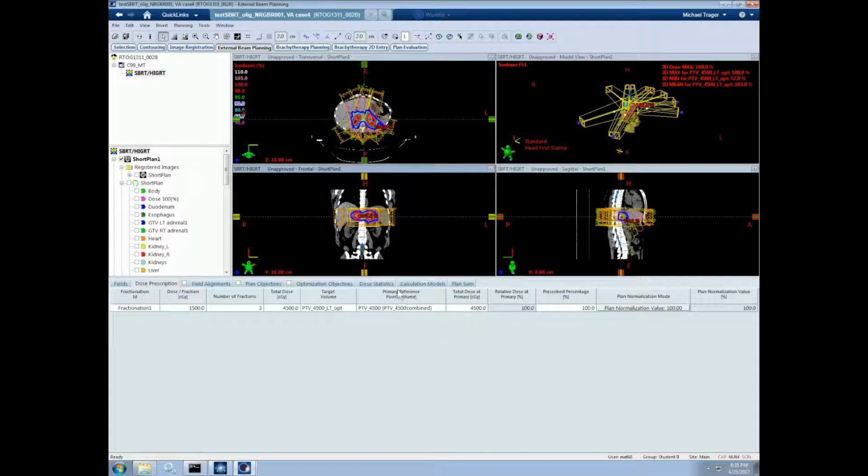The primary reference point is a point that records dose after each fraction of treatment and saves a running total of dose delivered. This point can correspond to a physical point within the patient for which we can calculate the dose, or it can be locationless, so that the dose per fraction associated with this point is simply the prescription dose. This is important during treatments because it is a safety mechanism to avoid over or underdosing a patient. We know the total dose delivered to this point at any time throughout the patient's treatment, and whether or not that value matches the expected dose at that stage of treatment determines if the patient has missed a treatment or has been treated extra.